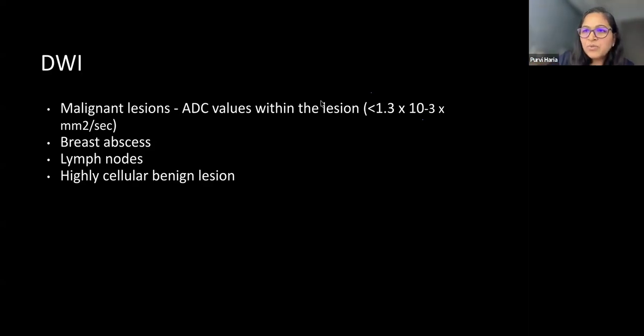More studies are needed before this is used in clinical practice to skip contrast imaging. Right now we are doing contrast for all cases and trying to understand how to improve our diffusion sequence, because if diffusion is not done well and you don't acquire a good image, you cannot really see the changes in the ADC value and the diffusion restriction. So this is about diffusion.